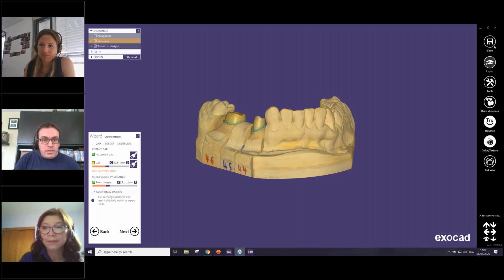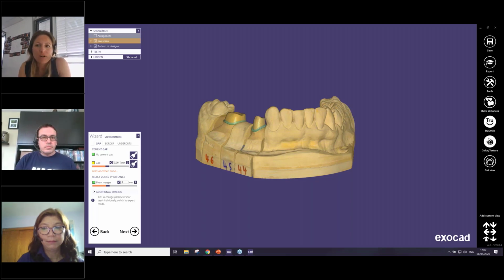The connector: several people are asking why it shows up in red at the end. Sometimes, if I have chosen, for example, 9mm as my minimum thickness or size of my connector, and I have changed some parts, maybe the connector is only 8.8.